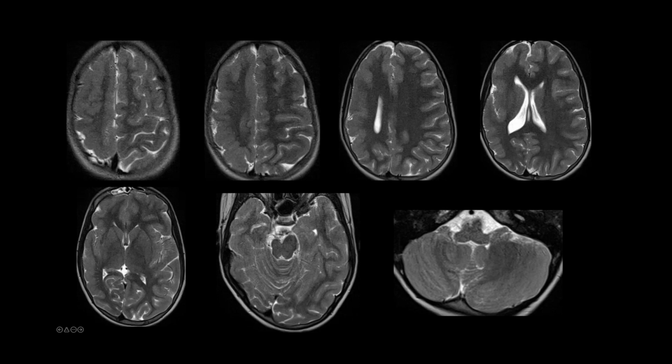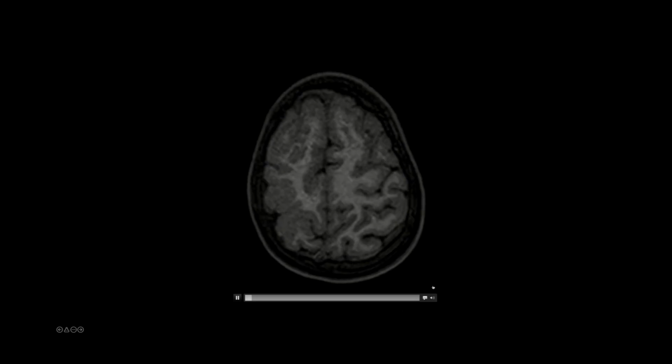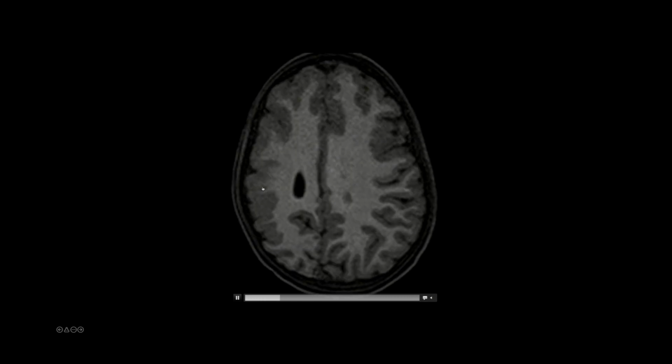The axial images, you can appreciate that the right cerebral hemisphere is completely malformed. There is polymicrogyria and also some degree of volume loss. If you see on the brain stem, it is demonstrating Wallerian degeneration, and also there is some hypoplasia of the ipsilateral cerebellar hemisphere. The left cerebral hemisphere, maybe the video will be better. So you can appreciate the extensive, though the image is slightly degraded, extensive malformed cortex on the right.